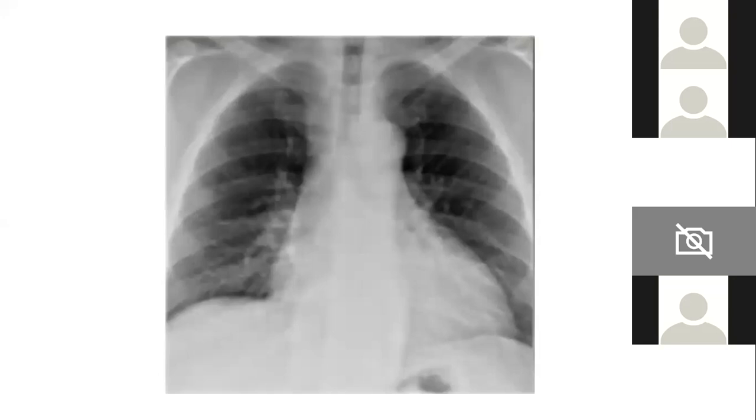Yeah, there is definitely a mass lesion. You need not give the diagnosis as of now. Just tell, okay, yeah, most of you got it. So this is an interesting case. There is a lesion here on the right side, and even on the left side, other than the aortic arch, you also have a bulge here, right? So both the paraspinal lines are deviated. Because of that, and bilaterality, it indicates it's a mediastinal lesion. Obviously, it's in the posterior mediastinum, and there are causes for bilaterality of the mass, right?